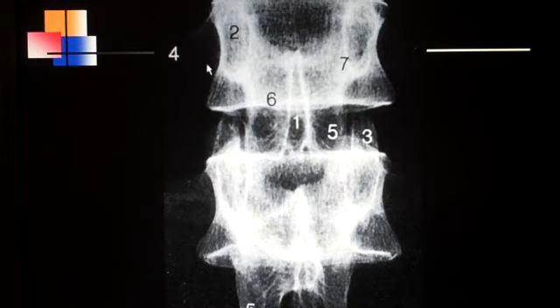Number five, again, I already did that, and that is the inferior articular process. Now 6 versus 7, you see the edge of the pedicle is this right here, and so number 7 is immediately medial to the pedicle, and immediately medial to the pedicle would be the pars interarticularis. Pars interarticularis, so all of this portion right here is the pars. Whereas number 6 is this section that is right up close to the spinous process, and that would be lamina. So we have pedicle, then pars, then lamina, then spinous process, in that order from lateral to medial.